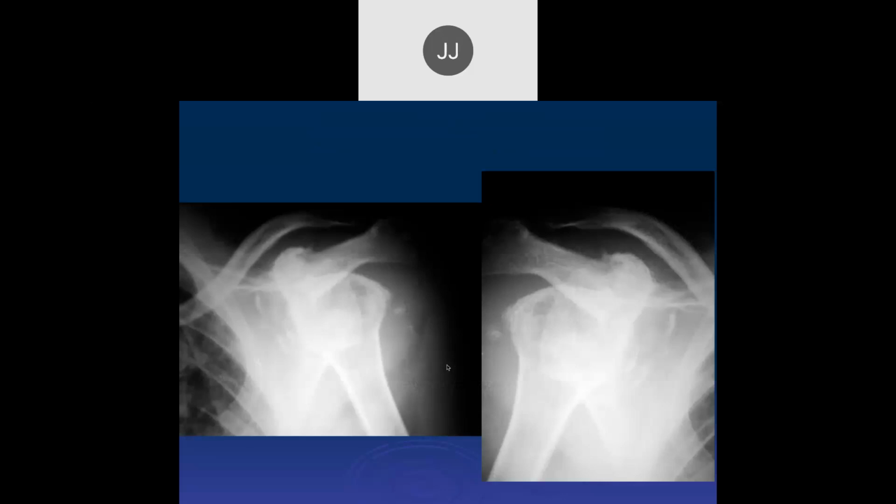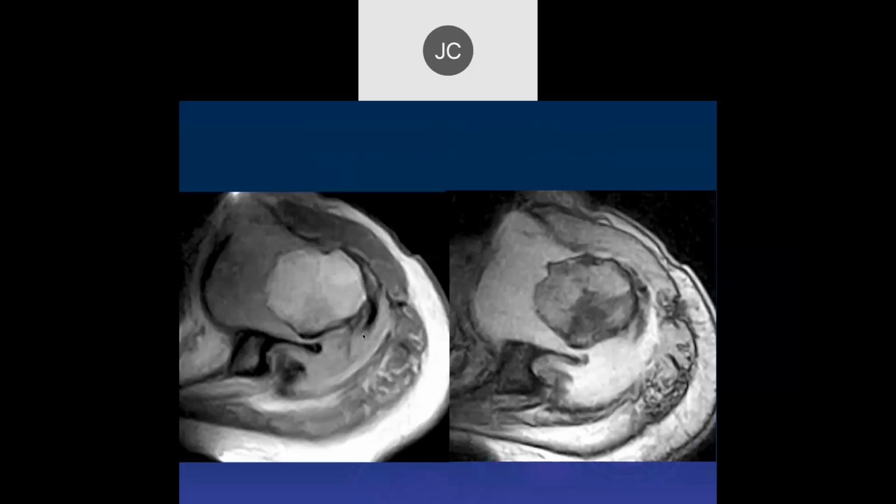So, on these radiographs, I know all you guys love plain films. Yeah, well, I think we have a dislocation again. I don't know. So this is another patient. This patient was markedly unstable. Go ahead, John. Definitely abnormal. Okay, X-rays. Here's the MR.